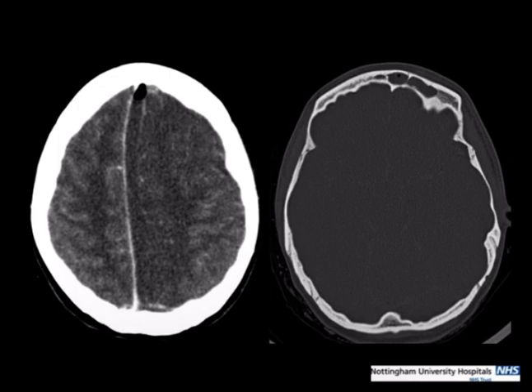They don't always have pockets of gas in, so it's not as easy as that usually. So this is going to direct your search down to the frontal sinuses, which you can see are opacified with a small pocket of gas there.